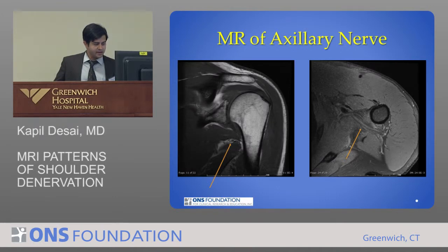Here again is a coronal T1 weighted image. Fat is bright. A couple little dots here down towards the armpit, towards the axillary recess. One of these is your axillary nerve. On an axial image through the same area, we see these tubes running through, just medial to the humerus here. One of these branches is going to be your axillary nerve as well.